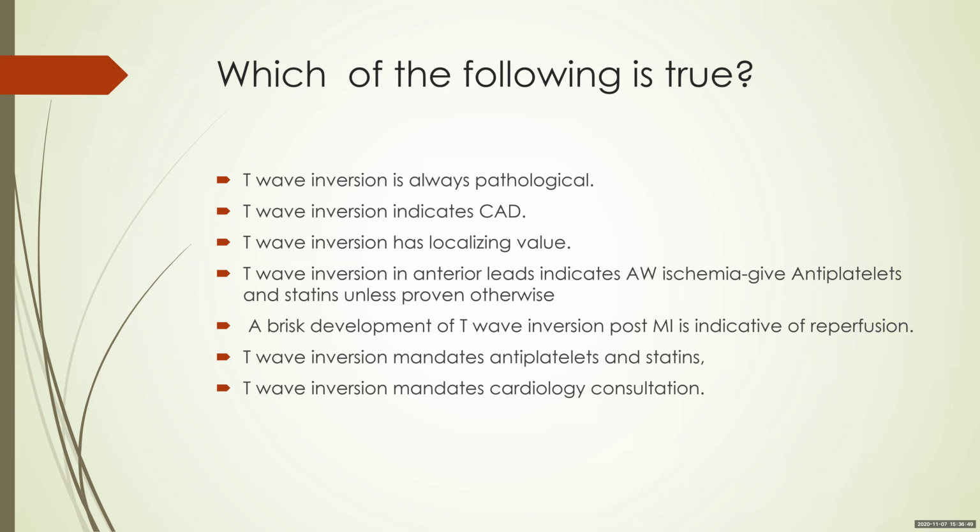So you can have a look at these options. If you require more time, you can press the pause button, and if not, you can go ahead with the video.